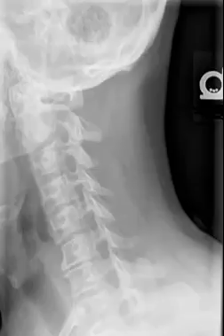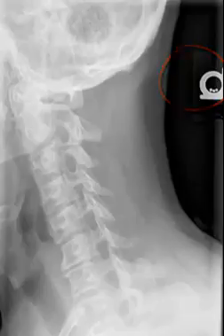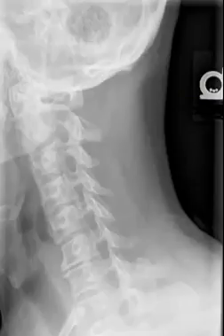When you're looking at cervical spine oblique projections and the clinician did not use a marker specifying whether it was an anterior oblique or a posterior oblique, we can simply deduce which side of the patient is the correct side. If you pay close attention to our radiograph in the right hand margin, your right hand side, you'll notice that there's a left marker on the radiograph. This implies that this is the left side of the patient, also implying that the area on the opposite side of the spine is the right side of the patient. So we don't always know how the patient was positioned prior to viewing the radiograph.